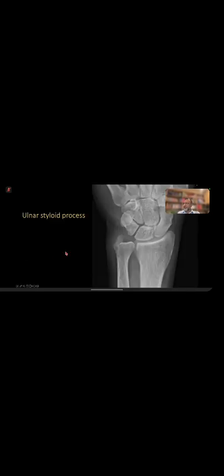So if you're looking at any X-ray for rheumatoid, start there. And chances are you may find some erosions there. You can look at the MCP joint and other PIP joints later on, but that's the area you need to concentrate on. Make sure that you look at that very closely and clearly, and not only the bone, but also soft tissues, and also the osteopenia. Look at this X-ray. Rest of everything is fine. This area is eroded, and there is surrounding soft tissue swelling as well. A little bit of osteopenia, focal osteopenia around the distal ulna.